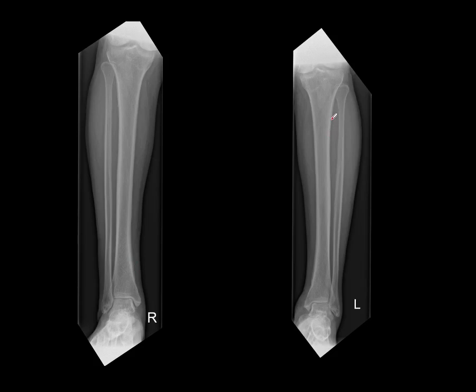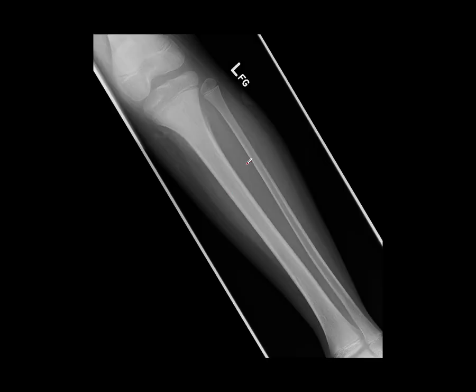If there isn't a lucent bit between the periosteal reaction and the bone, it may well be normal. Here's an example where it's not normal. This patient here with a Ewing sarcoma, this is not the normal interosseous membrane appearance. There's the periosteal reaction and underlying lucency. I know this is a bone scintigraphy talk, but I think it's important to understand these plain film abnormalities in order to be good at interpreting them.